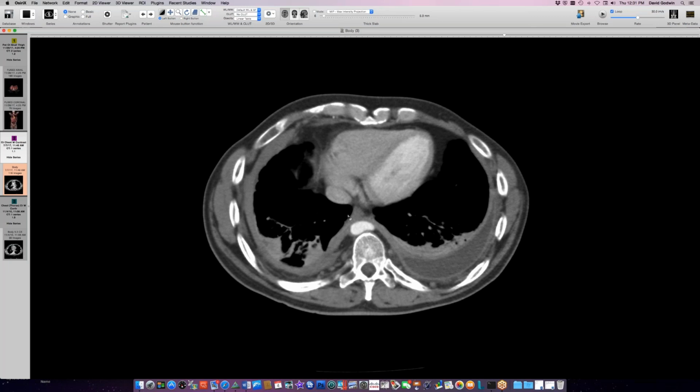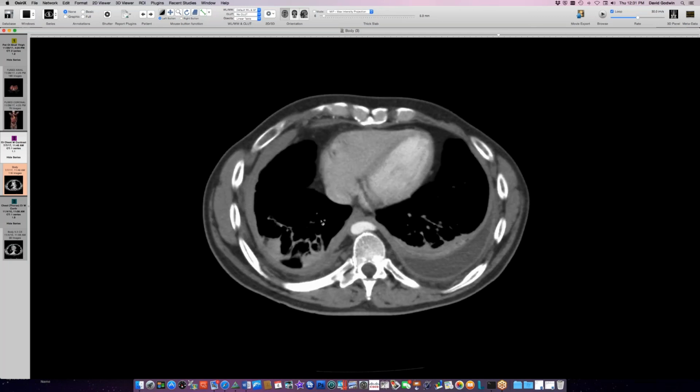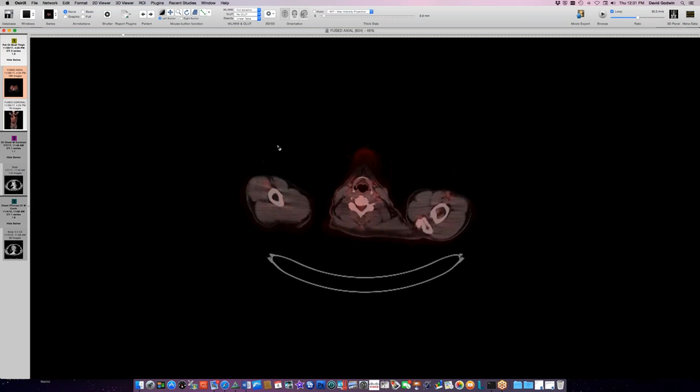And in terms of the patient's symptoms, they seem to be confined to the thorax with some shortness of breath, because you could see there must be some restriction caused by these pleural processes on both sides. But there was no evidence of autoimmune pancreatitis or abdominal findings that would go along with this. It wasn't retroperitoneal fibrosis.